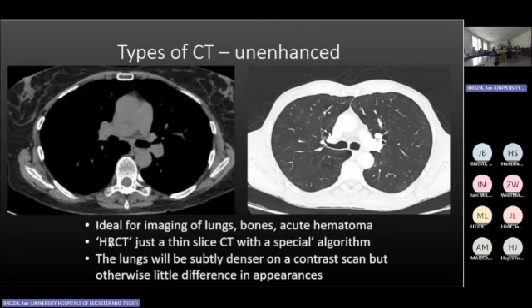There's one thing that is quite interesting. The lungs, because they contain vessels and there's blood flowing in, are also enhancing after contrast injection. So if you really want to assess the lungs in detail, you should do it without contrast, yeah? Because sometimes you can have increased density and it gives you the appearance of ground glass opacities, and it might be a false positive finding. It's just enhancement of the lungs.